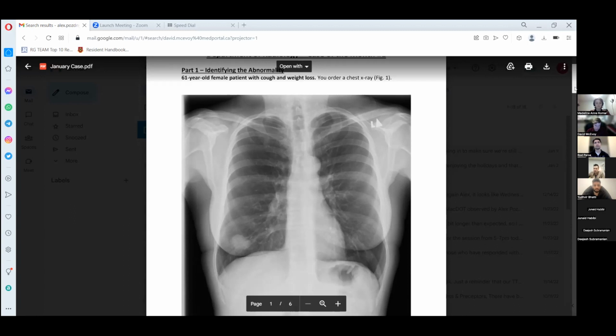And if we think about the different tissues that different body parts have, we have muscles, bones, fat, lots of fluid in our body, and we also have some gas, some air. The reason why chest radiographs are really useful is because there is a lot of contrast created by the lungs, and therefore the air, which is the least dense part of the body.